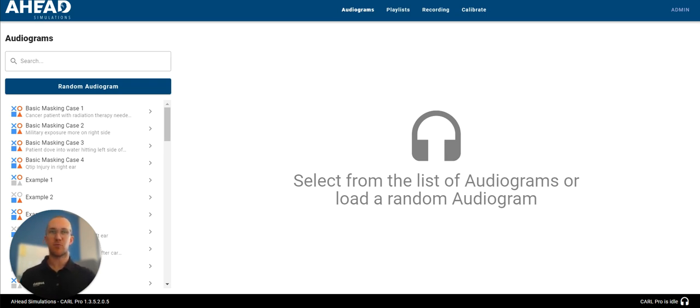Today I'm going to be giving you a brief walkthrough of the Carl Pro software. I won't be going into too many details about the specific functionalities or actually testing Carl's hearing today. All of that can be seen in separate videos, but hopefully by the end of this video you'll have a good understanding of what the different functionality is inside of the software and generally how to navigate around the interface. So to begin, what you see right now is the screen in which you land on when you first load up the Carl Pro.